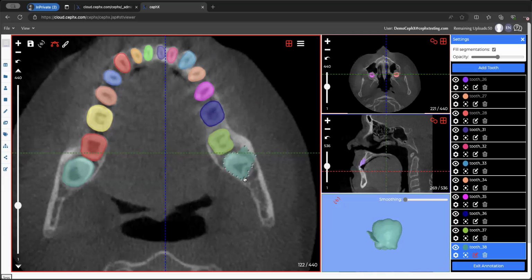If I click the up and down arrow, it will move between layers, and so on and so forth. There's also the ability to play around with a paintbrush if you really want to, kind of delicately add features. You can do that.